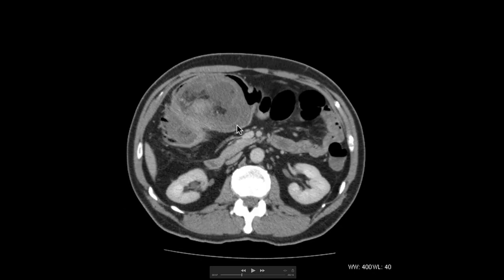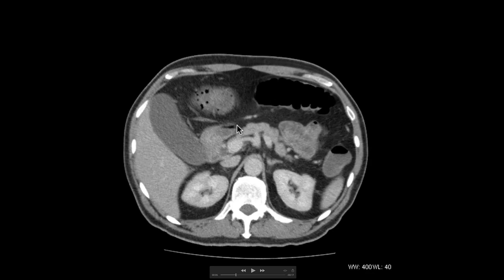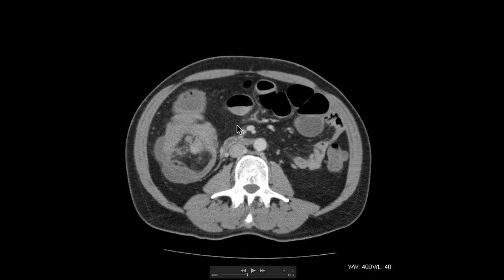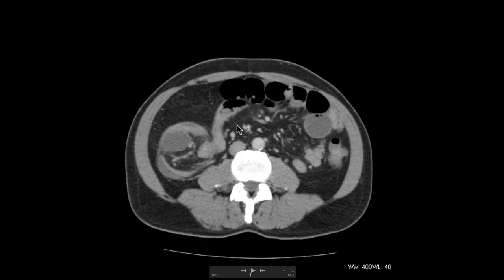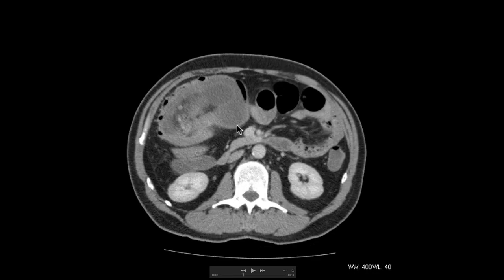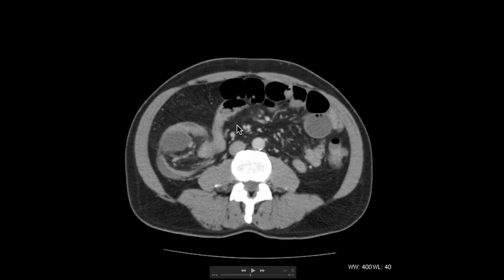And you probably want to do a CT scan of their chest to complete staging, so have a really careful look through that. So it's important not to get carried away and just relax as soon as you spot one abnormality. You need to still keep your system and make sure you go through things really systematically.